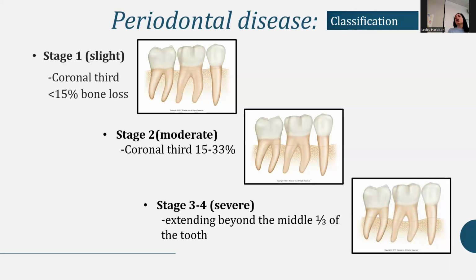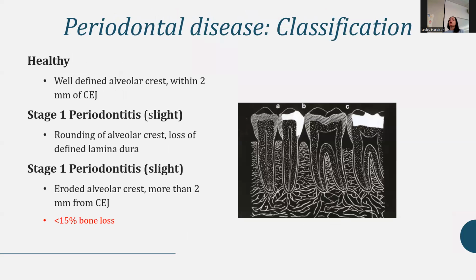And then there's an image. For sure, there will be some furcation involvement, most likely if you're in stage 3 or 4. And everybody knows what I'm talking about when I say furcation involvement, right? The term furcation involvement. So this is sort of just repeated information in sort of different slides.